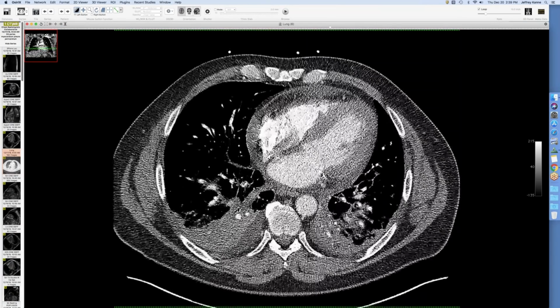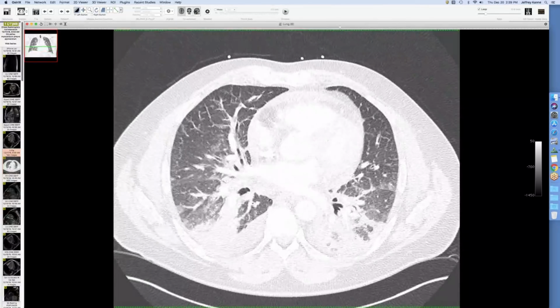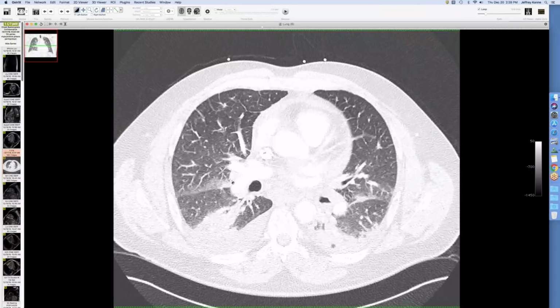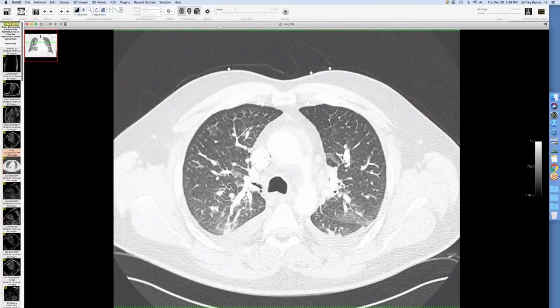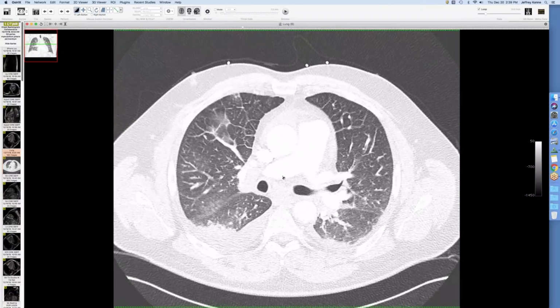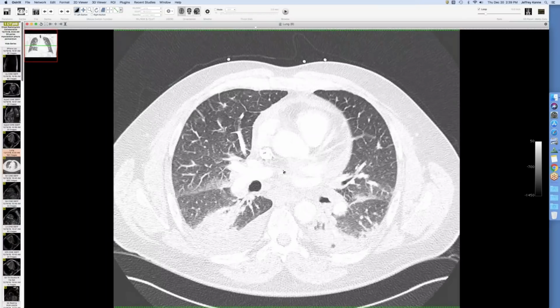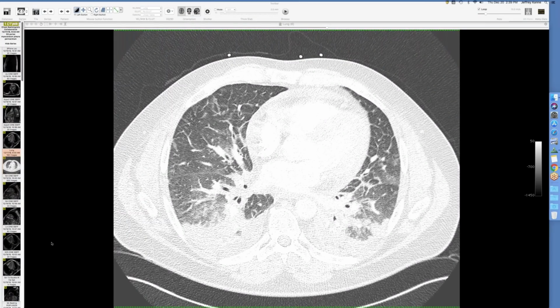Heart size is normal, and then he's got some more dependent consolidation in the lower lobes, whether or not that's something else, and just a lot of engorged lymphatic tissue. So it looks like a little almost tracheal bronchus-like variant, but looks like diffuse lung edema. An echocardiogram there showed the pericardial effusion, but relatively normal function. But he does have a very high peripheral eosinophilia.